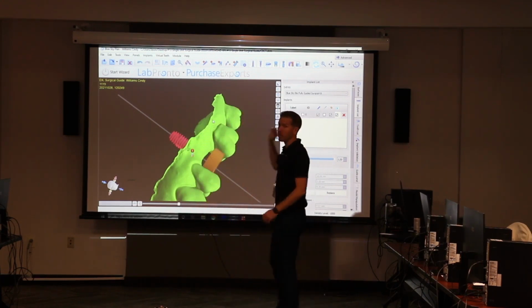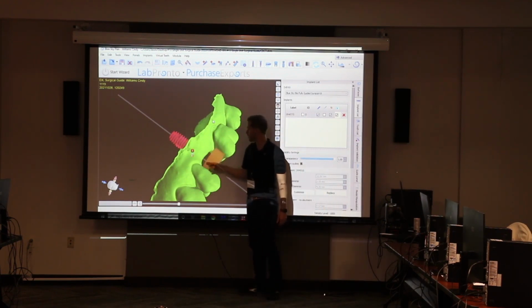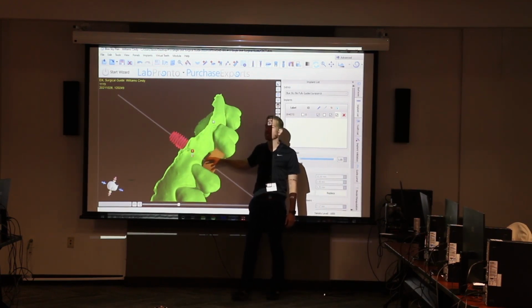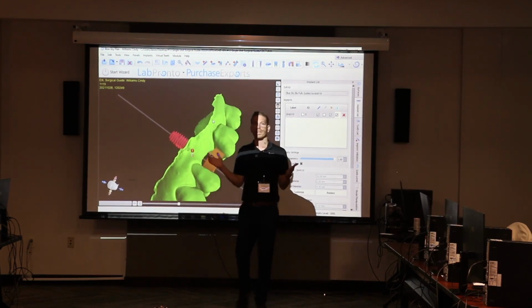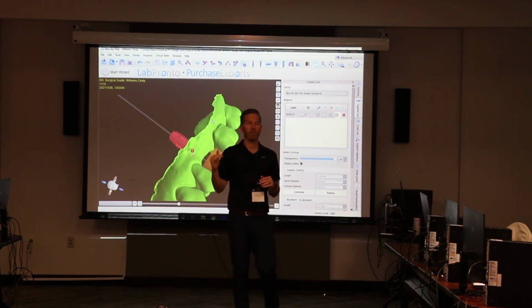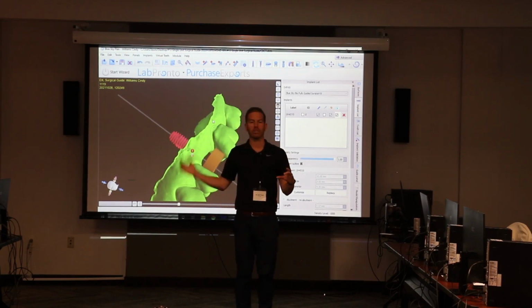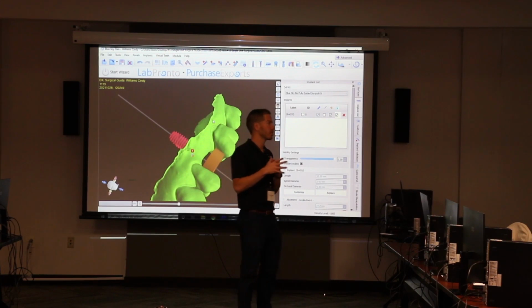The reason why we're starting with this case is because where I place this implant, this guide tube is above the tissue. It's got plenty of space. This is not a complex one. It's not one where you have to change the offset. You can leave the offset at that 8.5. You don't have to worry about it. If you want a 10 millimeter implant, you use a 10 millimeter drill. You just don't have to think about changing and tweaking that. That's why we're starting with this case.